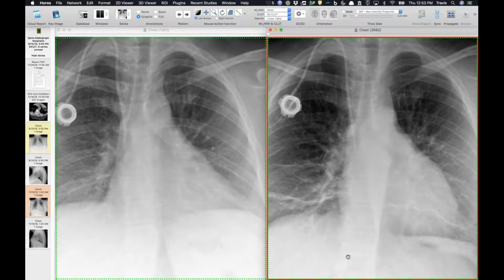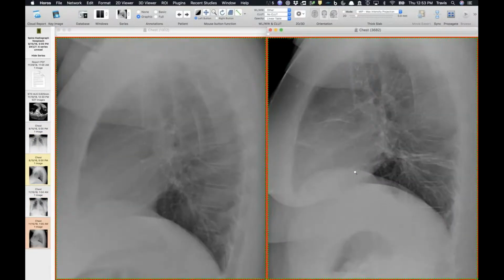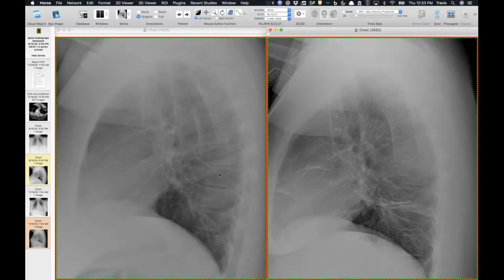Yeah, at the level of the distal left main bronchus, to the left of the spine, is a new mediastinal lung interface that is different from what it was before, and it extends superiorly. Yep. Well, and this is also a reminder, and it's why on the lateral my search pattern usually starts with running down the spine. So you can see, again, 2016, 2018. So you can see what's happened right at that level.